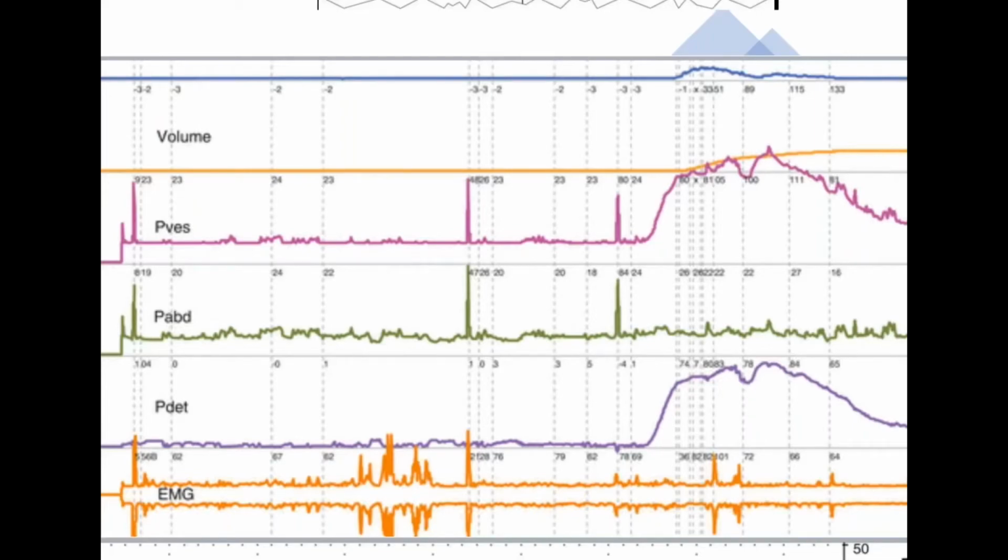Hello everyone. In this video, we are going to learn how to interpret the cystometry in an easy way. The cystometry is one of the main urodynamic studies to diagnose detrusor overactivity, stress incontinence, or even normal urodynamics. In case the patient is not responding, we need to confirm that everything is all right.